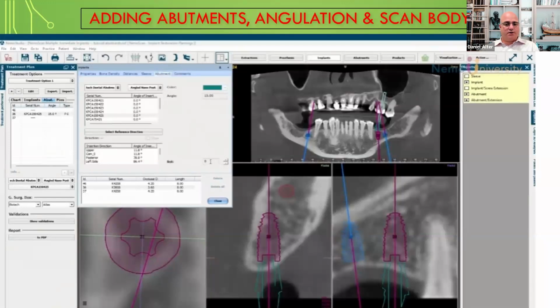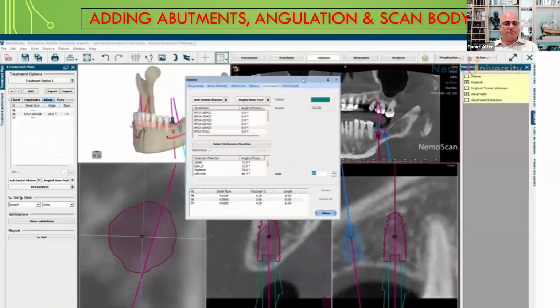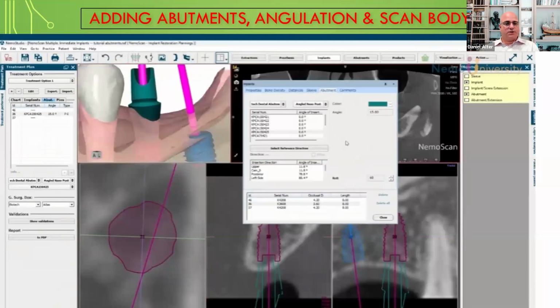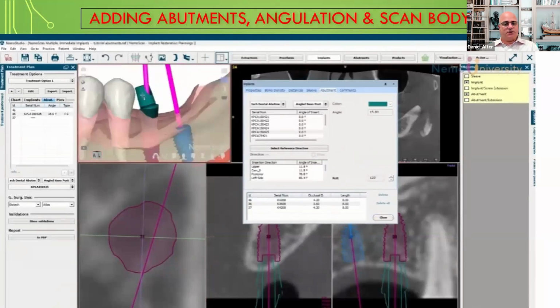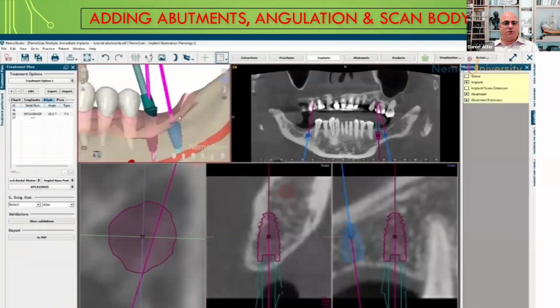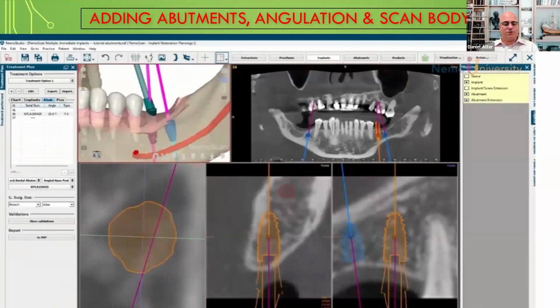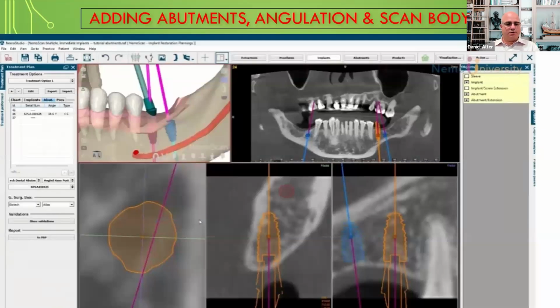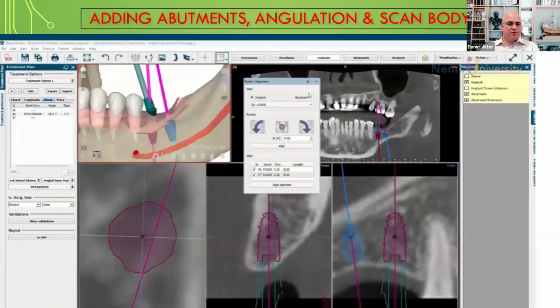Now we're going to go ahead and reintroduce the ability of doing more crowns or what have you. So we can select that prosthetic. We can angulate it as you see here on the top left side, and then we can go right into see where the access hole is going to emerge out of. I think this case, if memory serves me correct, ended up being a screw-retainable, where we utilized that custom abutment to then do an E.max with a hole in it to finish it off.